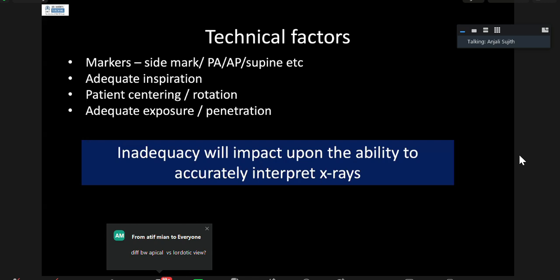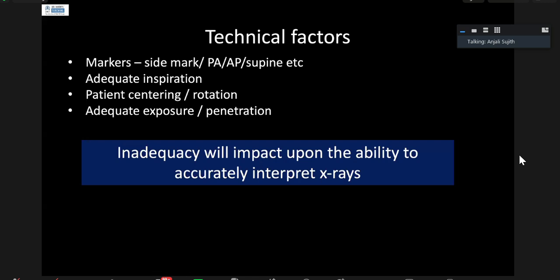This is all manually placed by the radiographer. So a label would be there which says AP or AP supine or AP erect or AP semi-erect. Or if it is a PA view, most of the time that label may not be kept, and we infer it is PA.